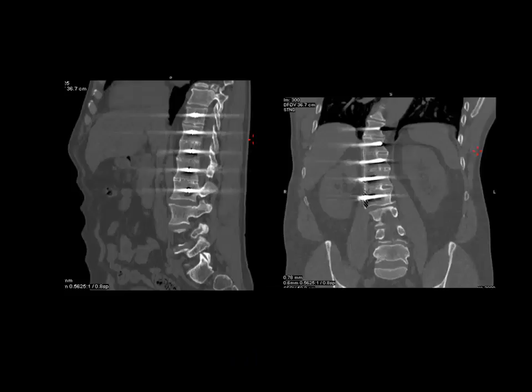These are transpedicle screws. Now looking at it is just gone through, so you need to look at all the slices, so whether there is any lucencies around the screws, and you have to window it properly, otherwise because of beam hardening you will not be able to see it. So if you look at this one, this one, this one relative to each other, these two look relatively abnormal. There is some air in between, but you still cannot see whether there is lucency or this is artifact.